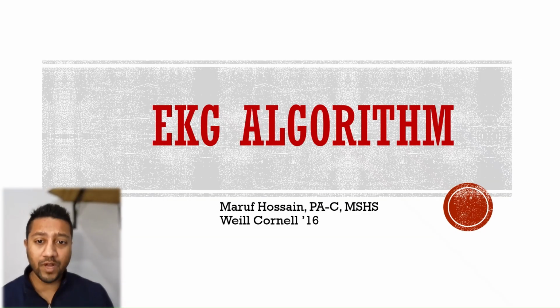EKGs can feel overwhelming, but in reality, the board exams only test a handful of EKG patterns. In this video, I'm going to show you a nice, simple algorithm that you can use to tackle most EKG patterns that you see in front of you and know exactly what the next step will be. Let's get right into it.